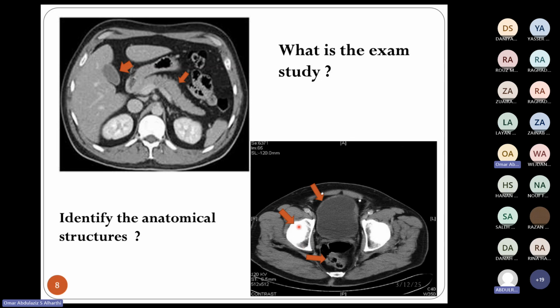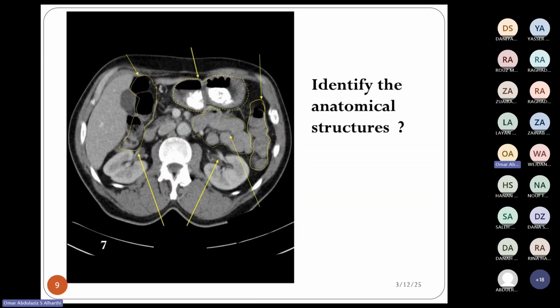It is called the acetabulum. Okay. Which side? Right side. That's because it's labeled here right, and you know this side is always right and this side is always left. Okay. So what is this?